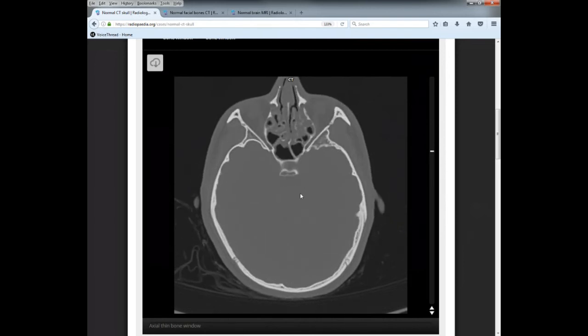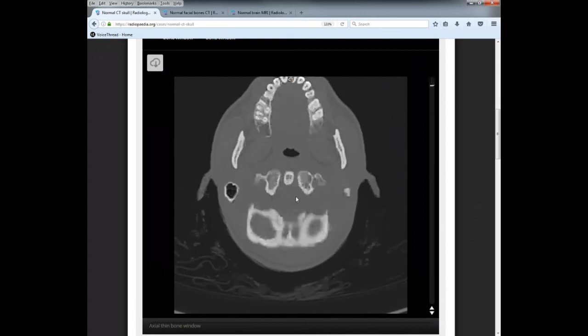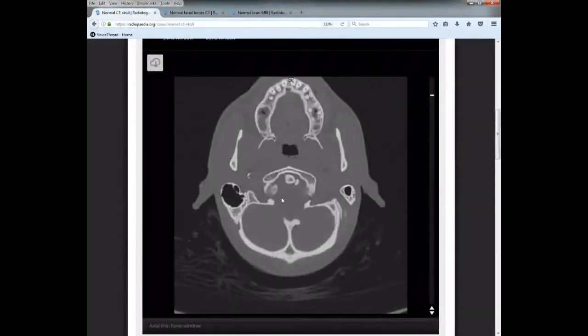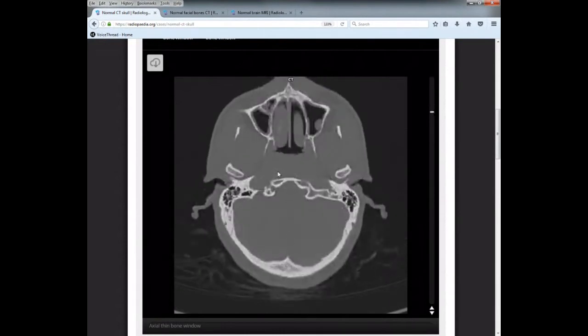Foramen. So now let's go to the foramen that you have to know. Obviously the big guy, which is, this is again kind of an off plane, but your foramen magnum is in here. Okay, so that's foramen magnum, big one. Foramen ovale.